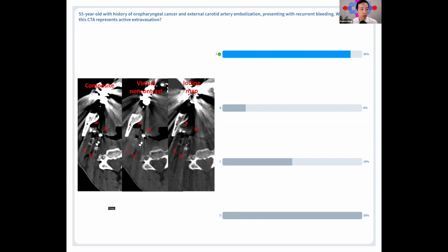You just have to know what is the most likely bleeding source. Well, it's the stuff that's at the surface of the pharynx, and not this stuff that is very deep and very regular in appearance. It's this stuff that's irregular and near the surface. If I showed you more images, you would clearly recognize this as a normal vascular structure, the internal carotid artery.